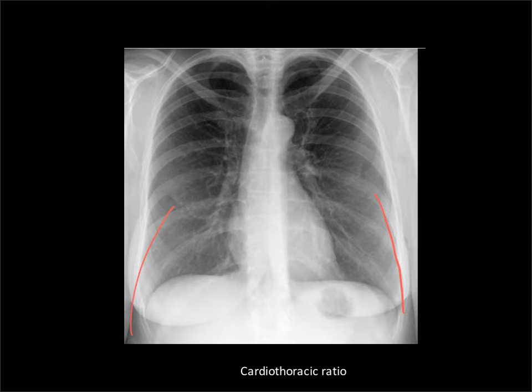So what's a normal cardiothoracic ratio? Well, we usually take it as being 0.5 for a PA study. For an AP, we're going to take it as about 0.6. That's on an upright AP study, not a supine one. But just to let you know, this number did not come off the mountain engraved in stone, and there is significant variability with age, where hearts normally tend to get a little bit larger, as well as body habitus, and there are a bunch of things that can make your cardiothoracic ratio look abnormal when it is indeed normal, but that will be a subject of another talk.